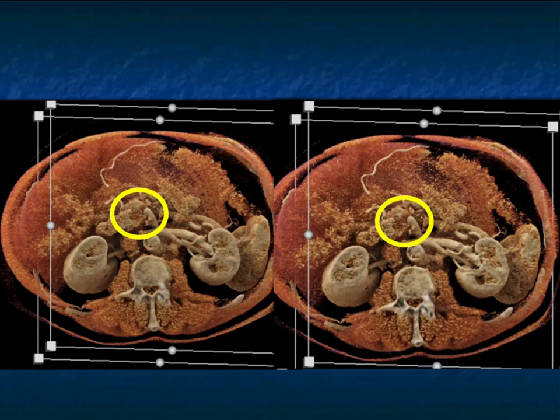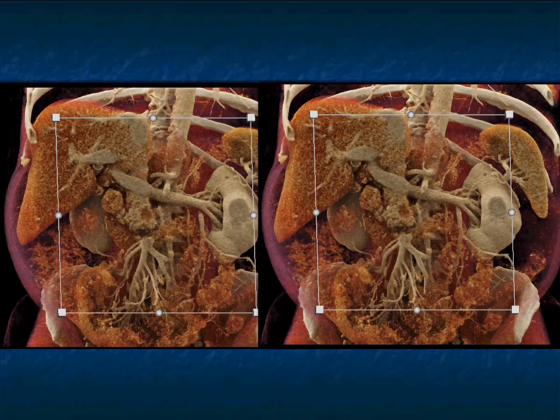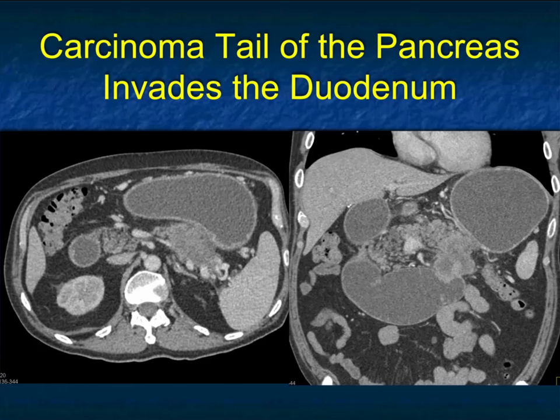So those are really the tumors we need to pick up, and we need to pick up tumors even smaller than that. It's really the only thing right now that's going to change the game is early detection of pancreatic cancer. And again, here's a nice example, same patient, textural changes in the gland, and there's the tumor. There's portal vein, there's the patient's splenic vein, there's SMA, there's celiac and hepatic artery. So the 3D mapping is ideal for this application, and we are trying to figure out how much better we can make it.